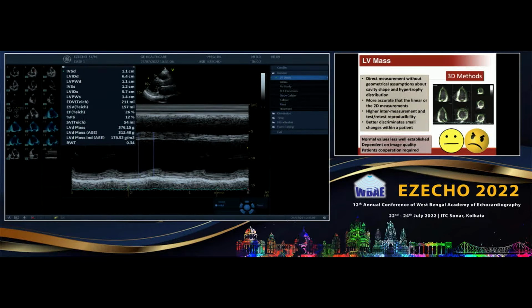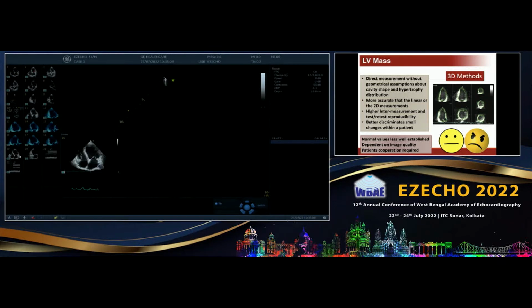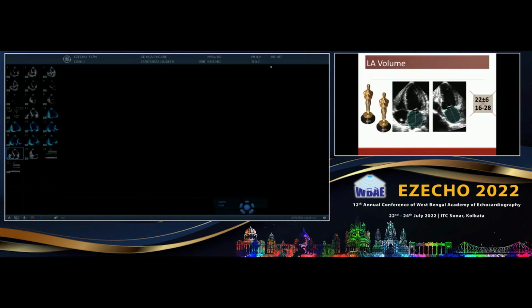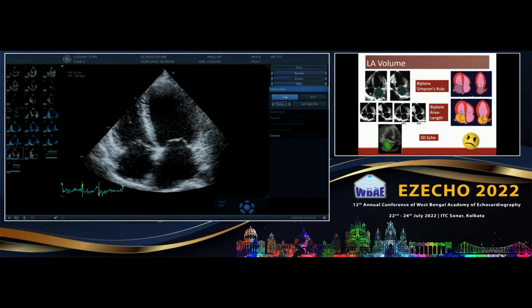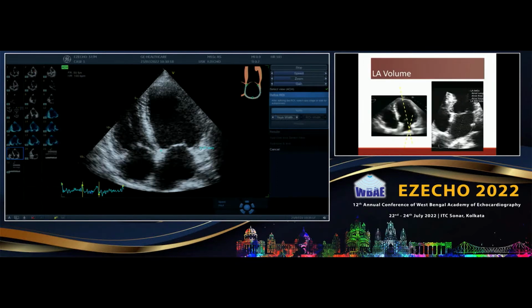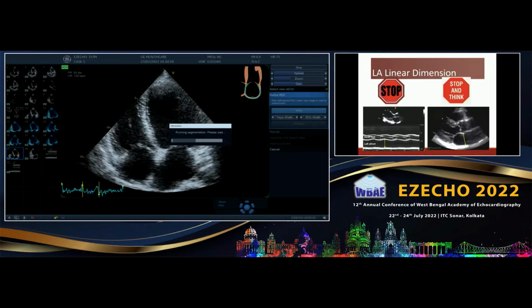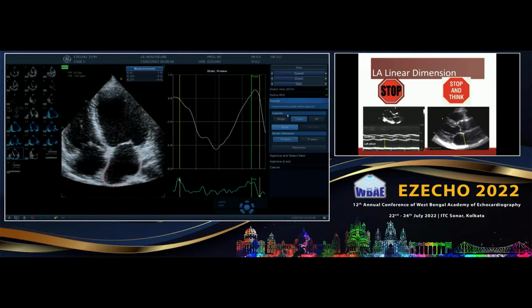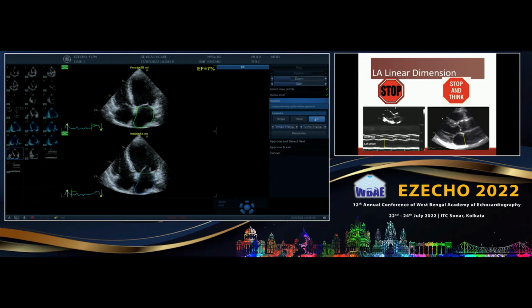Dr. Sengupta and Dr. Burkule, one small issue. Sometimes we see that it's a normal patient or just a hypertensive patient. The wall thickness is maybe 13 millimeters or a little more or a little less, but the cavity size is low, say 37, 38, 39. In these cases, visually it looks like a concentric hypertrophy, the relative wall thickness is high, etc. But the mass by this formula sometimes doesn't fit the criteria of 95 and 105. They come out to be 87, 78, something like that.